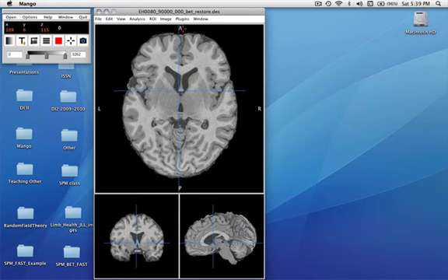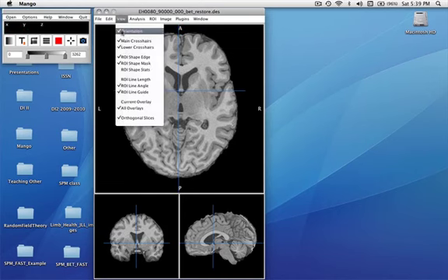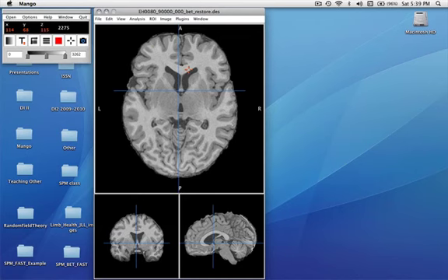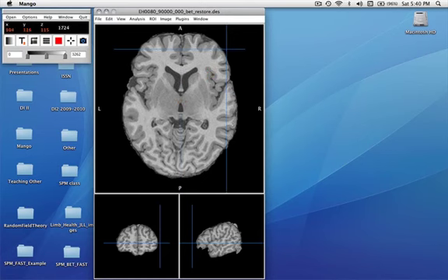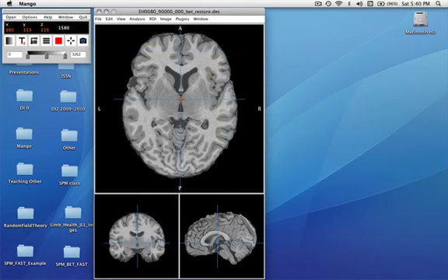You'll also notice that we provide anatomical directions. That shows up here as orientation, so we'll leave those turned on for now. We work very hard in Mango to make this correct. We read it out of the DICOM headers, we read it out of the image headers for both the ACR-NEMA styles and for NIfTI. If they were encoded correctly with the images, we read them correctly, and that's extremely important in terms of left and right. If they are not right, we give you an option to change the orientation and save it with the orientation corrected.